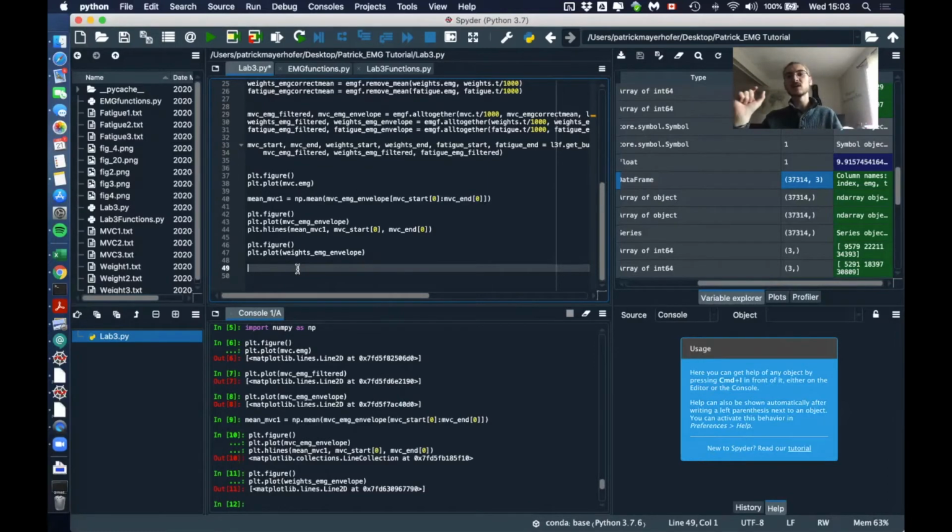Theoretically, in the end, you would have lower frequencies of the muscle activation than in the beginning. But let's see. So first of all, we need to isolate half a second of the beginning, half a second of the middle, and half a second of the end of the burst, right? Also for this, we will now use our filtered data.